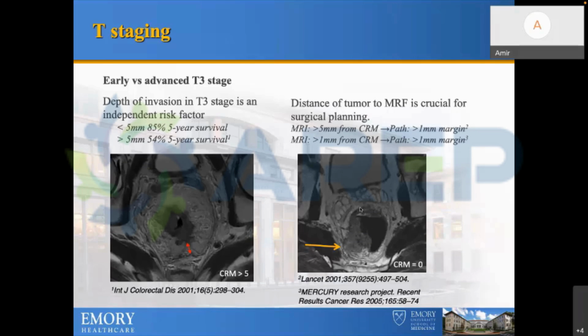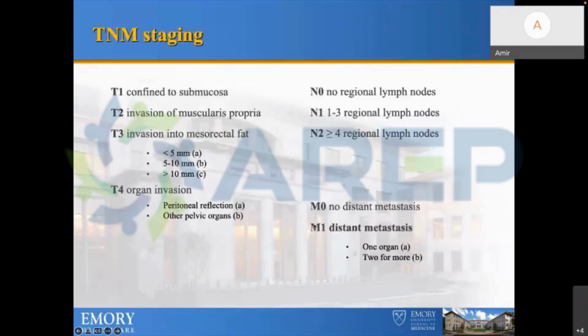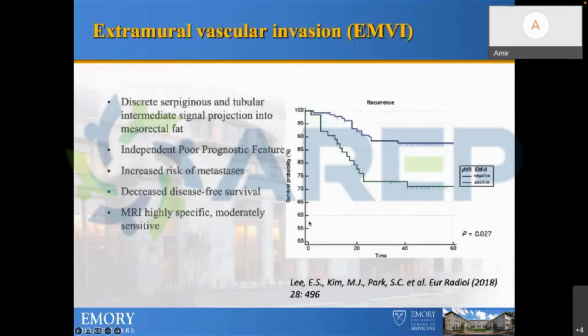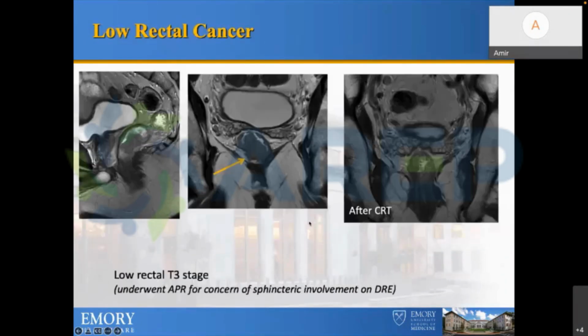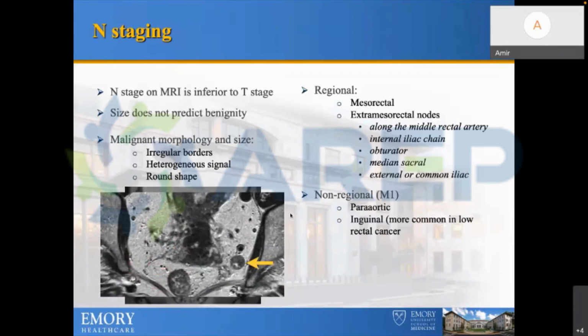And when I'm restaging, I always look at the pre-treatment exam. I look at the diffusion weighted imaging, and I look at the T2. So you're going to see the tumor that was bright and heterogeneous on T2 just gets replaced by fibrosis, which is T2 dark.